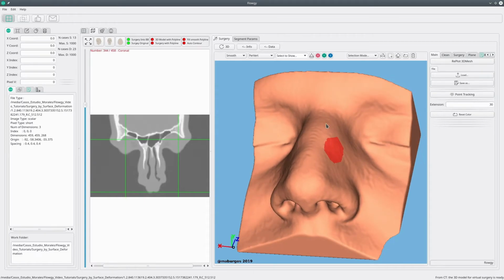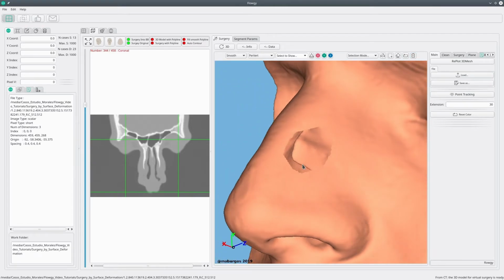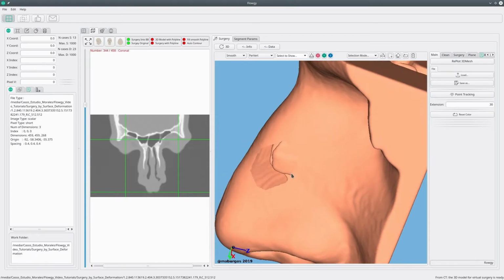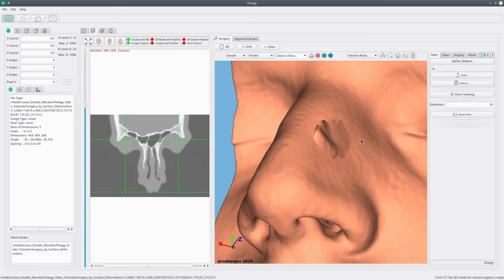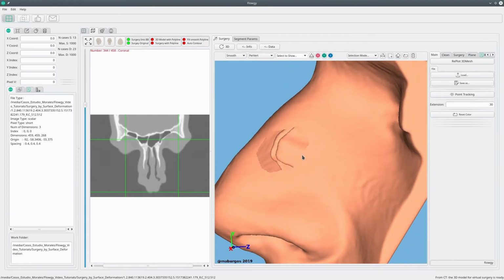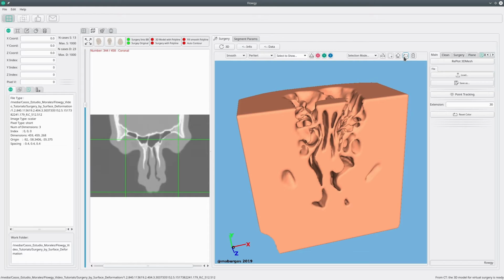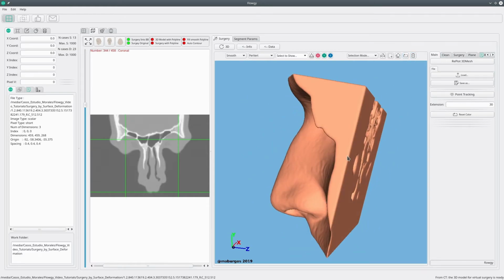However, it is not recommended to remove cells in the virtual surgery model, since this would generate a hole in the mesh and would make the model invalid to continue to the virtual surgery, and we would need to regenerate the model. Therefore, it is only advisable to use the option to delete cells for visual purposes.